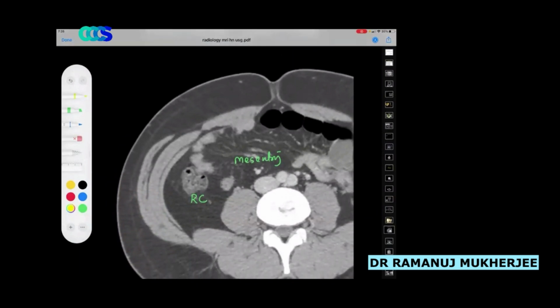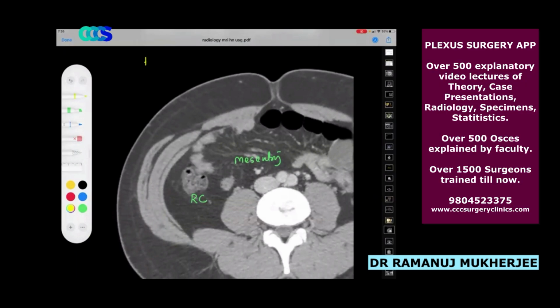Whenever you think about a hernia, whether we should do a CT scan, we are coming to when you should do a CT. Understand the CT concept, that is very easy. This is the umbilicus, always remember. At the umbilicus, please see the peritoneal continuity. If there is an umbilical hernia, obviously this is going to be like this. Very simple bottom line things.